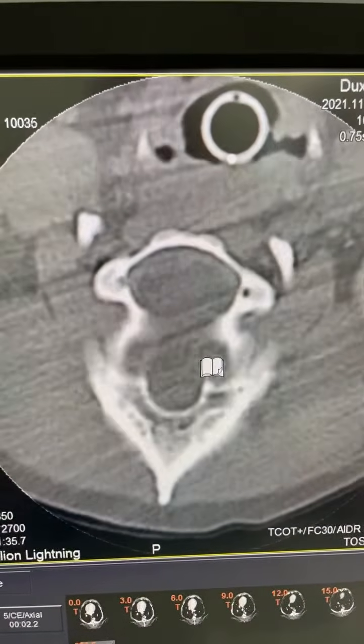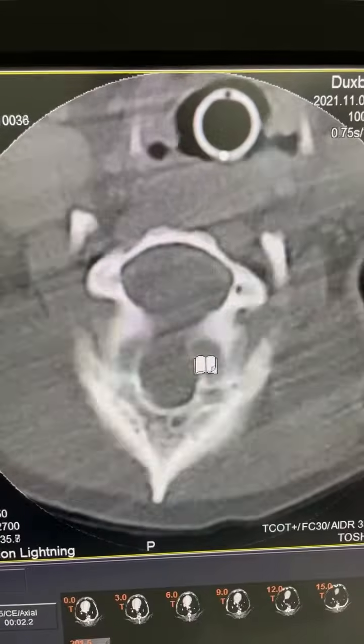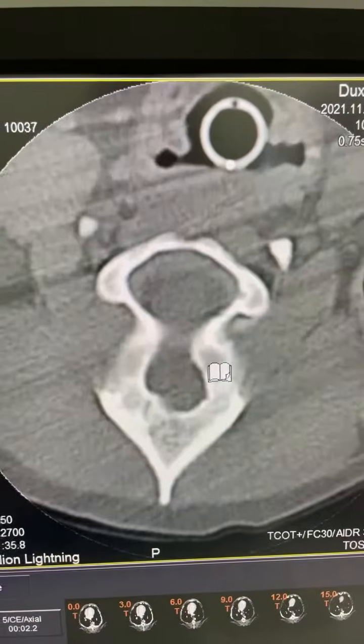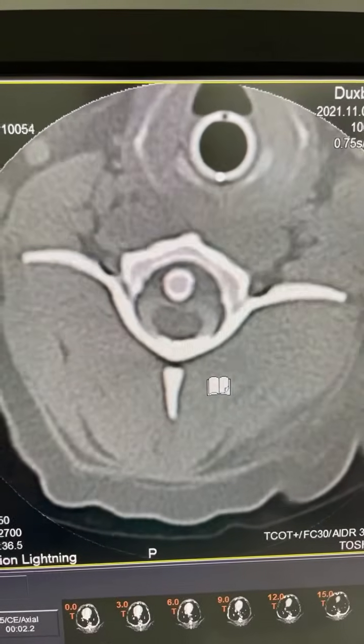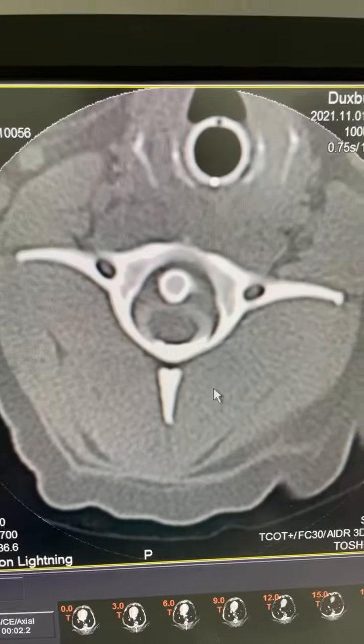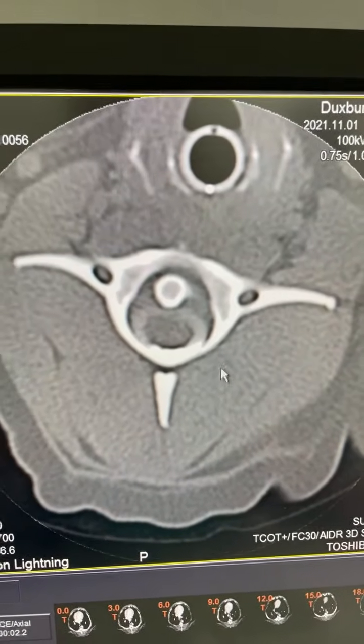And that's a perfectly done CT myelogram. Sometimes we inadvertently get contrast up into the brain, but in this case, Nadia did a great myelogram, where we don't have any contrast up into the brain. Contrast in the brain can cause seizure activity after the procedure.